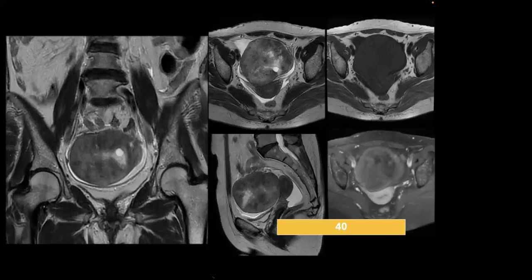Del, why are you calling it adenomyosis? Is it inside the uterus or outside? Ovaries, can you see the ovaries?